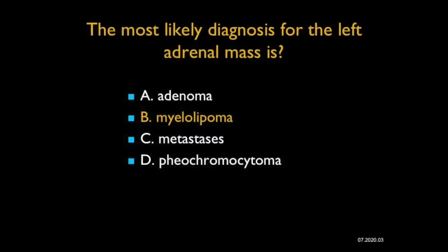This is the classic appearance of a leave-alone myelolipoma. Again, myelolipomas are benign, no malignant potential. Occasionally, they will be removed if they get larger than classically 7 centimeters or if they're causing any symptoms at all to the patient.